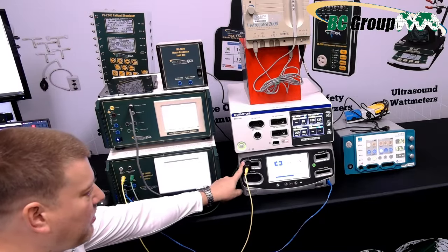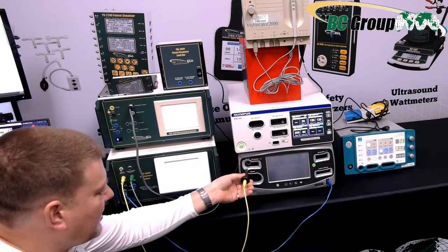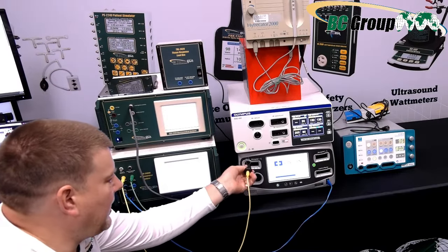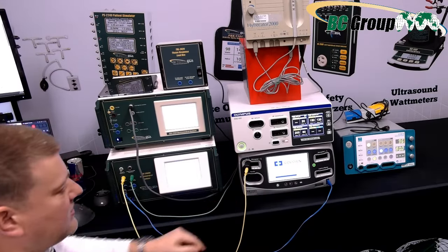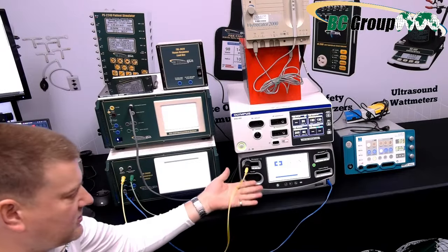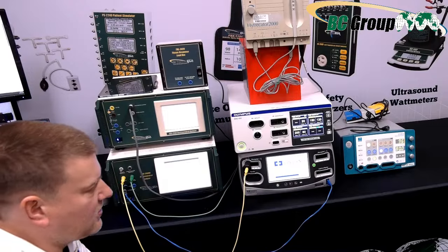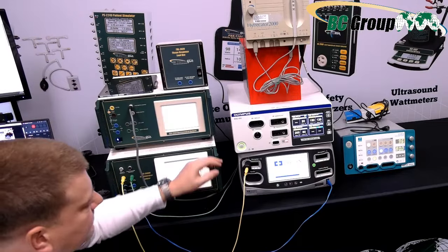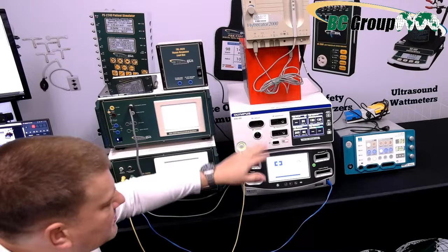For testing the monopolar over here, we have this adapter, which we do actually sell in our store, and it allows you to connect a banana plug safely to the ESU analyzer, and it's a contained environment. These silicone high quality cables can handle the high voltage and high tension. The Olympus is kind of a special child. It has a bunch of extra features and whatnot.